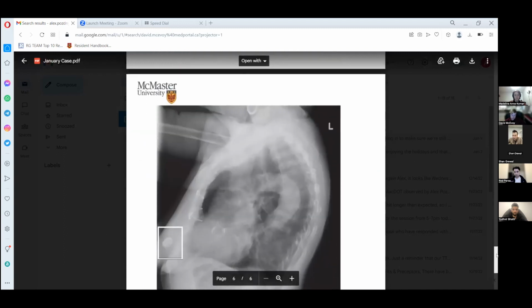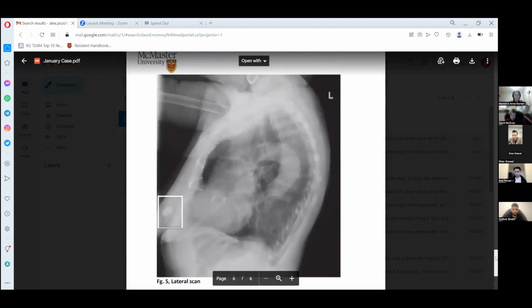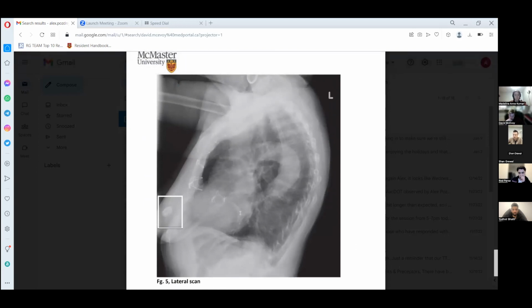Okay, and yeah, we localized this essentially. We can also confirm here in the lateral view that this patient probably has a lot of kyphosis, as you can see in the thoracic region. We can also see they have some valve replacement, and I'm not going to go into how to localize the valve. There are ways on radiographs to tell which valve it is, but it's a bit more advanced. But that's why they had cardiac surgery. That's why they had this sternotomy, and they had this valve inserted to treat their disease.